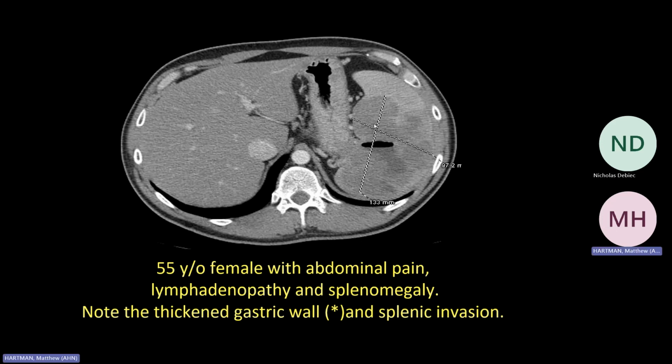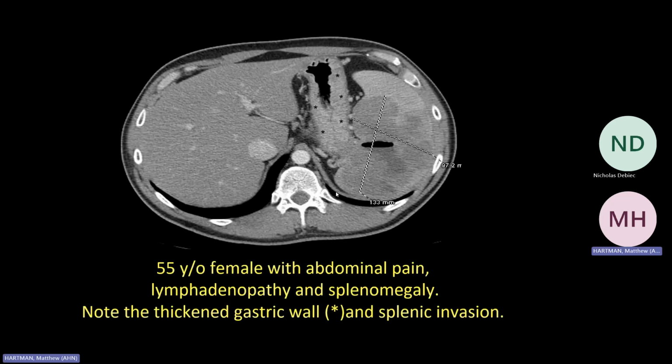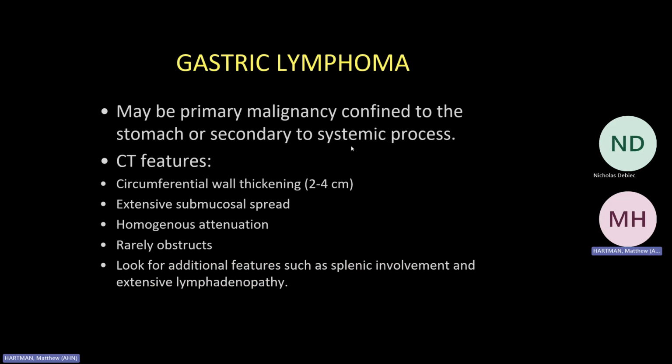So remembering every Hartman differential, Mets, lymphoma, that's a great guess, especially with a big spleen, making us think lymphoma. And that was the case there, gastric lymphoma. So this is pretty advanced lymphoma to be involving both organs like that, but lymphoma nonetheless.